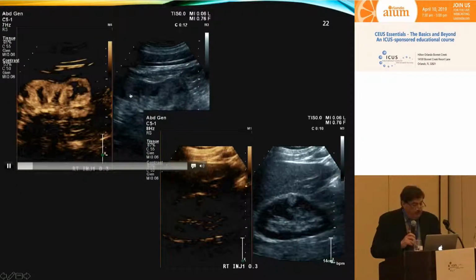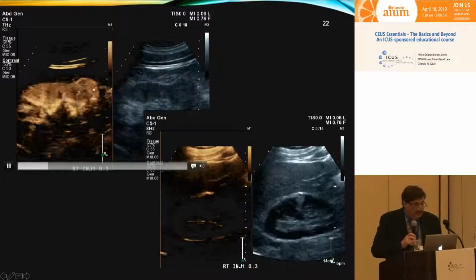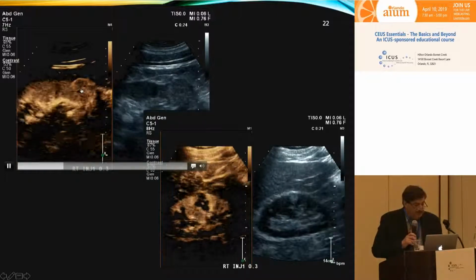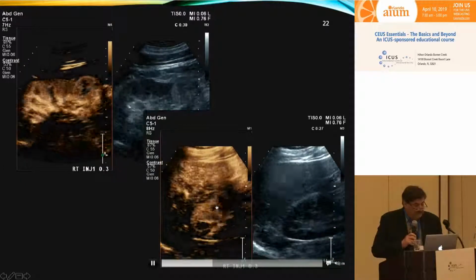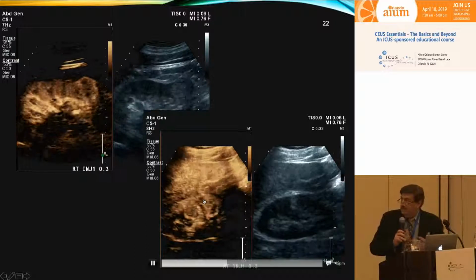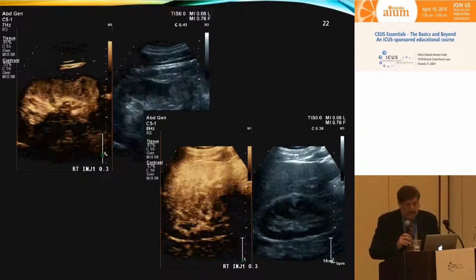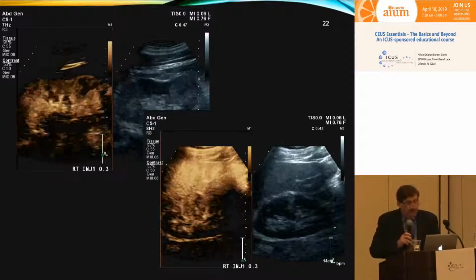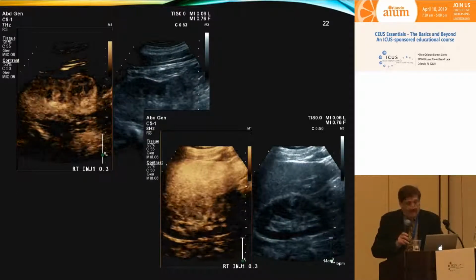So here we have two echogenic lesions. And just to show you, this echogenic lesion shows marked enhancement. There are some areas of necrosis inside, as a renal cell carcinoma, versus here in this angiomyolipoma, you can see there's much less enhancement than the normal cortex, although there is some flow within the lesion. So again, we actually do a reasonably good job in deciding something is an angiomyolipoma versus a cystic renal cell carcinoma, although I think in a fat-poor angiomyolipoma, we may interpret it as a renal cell carcinoma, but we haven't had any of those in the study.